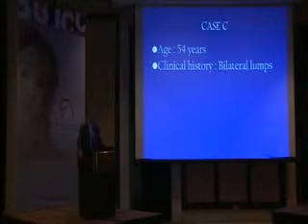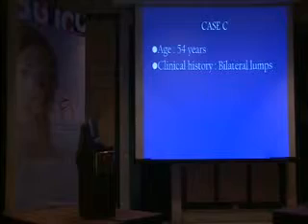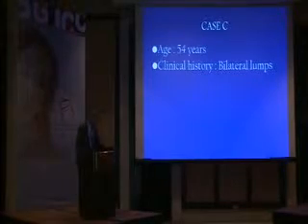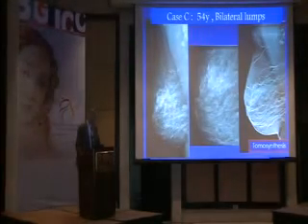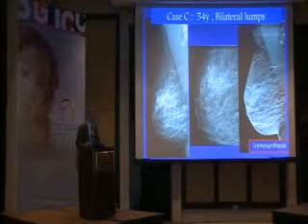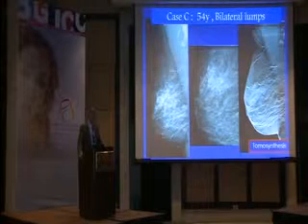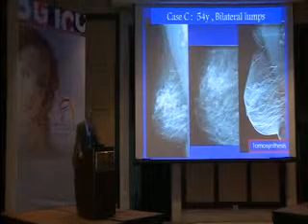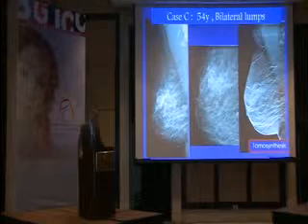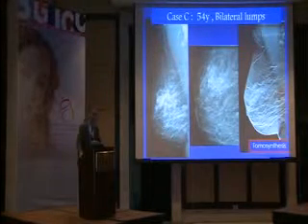Now, a 54 years old lady with bilateral breast lumps. She feels lumpy breasts. It's very classic and very traditional for everyday practice. But to make it easier, I present the right breast, because it's one of the concerns. This is the CC, MLO, CC, and the tomo view of the pathology.